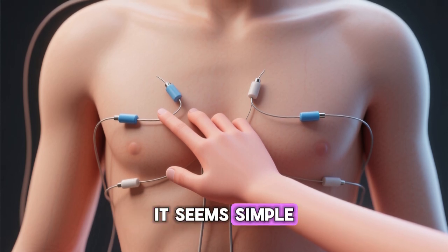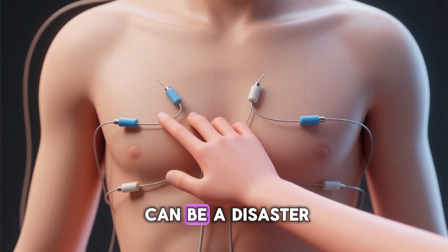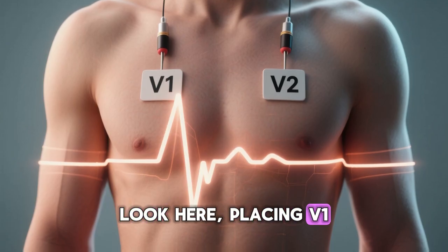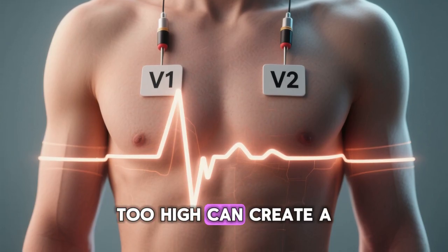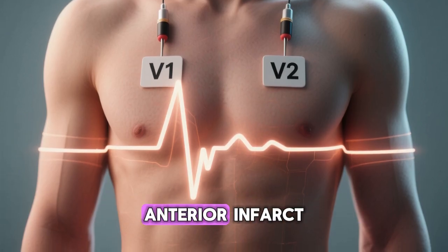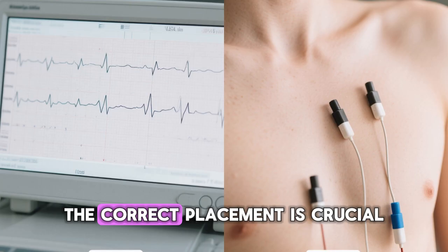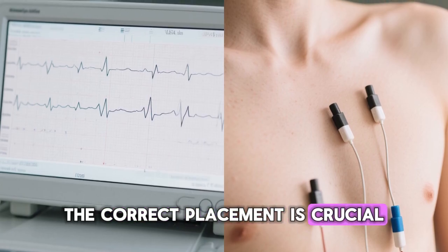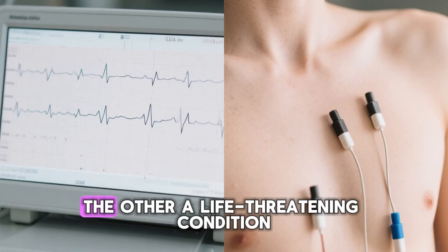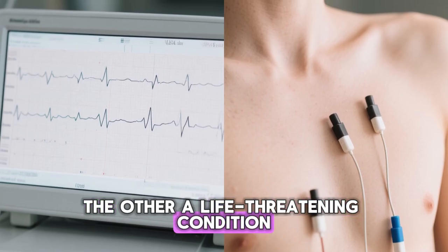It seems simple, but getting it wrong can be a disaster. Look here, placing V1 and V2 too high can create a pattern that mimics a serious anterior infarct. The correct placement is crucial. See the difference? One is a technical error, the other a life-threatening condition.